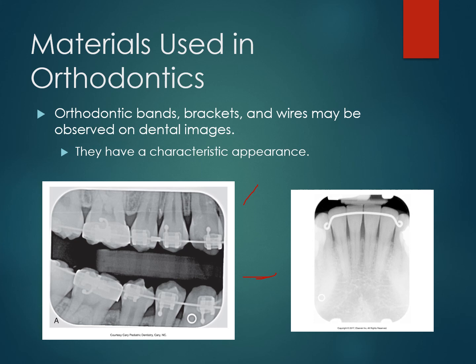I would say probably once a year, I would see something that was weird, that I hadn't been exposed to before, that an orthodontist was doing. I mean, they'll do whatever it takes to get those teeth where they need them to be. And I don't have a degree in orthodontics, so some of those things to me were completely new because I'd only been exposed to braces and lingual bars. But palatal expanders look really funny on X-rays, and then space maintainers look kind of funny, not as weird. It looks just like a band and a bar. But yeah, you're going to see a lot of random things.